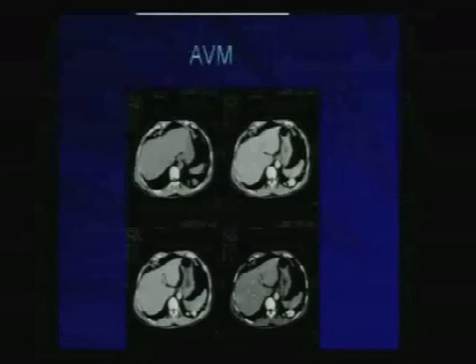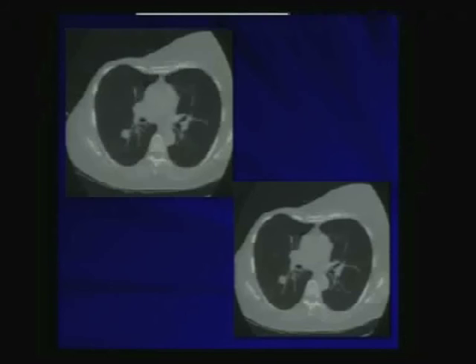But again, as a pulmonary nodule, they have different patterns to recognize. You can look at the appearance of the nodule, you can look at the content, and then try to determine whether this is benign or malignant. And of course, CT can allow you to plan for transbronchial biopsy. This is a typical bronchus sign in a patient with breast cancer.